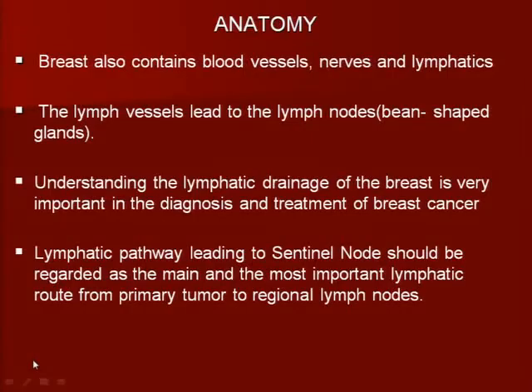Blood vessels, nerves, and lymphatics are also noted in the mammogram. Basically, you only see blood vessels. You can see lymph vessels that lead to lymph nodes. These lymph nodes are the bean-shaped glands that you usually see in the axilla. But you can also see intramammary nodes sometimes within the breast. And we have to understand the lymphatic drainage. Why? Because it's important in the diagnosis and treatment of breast cancer.